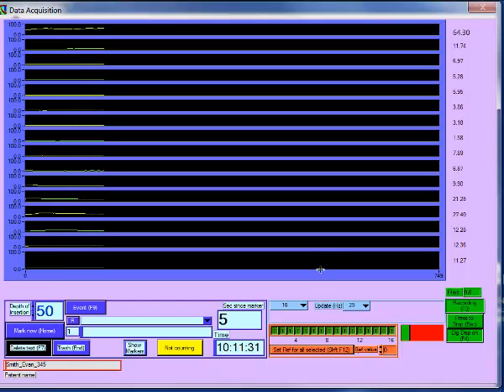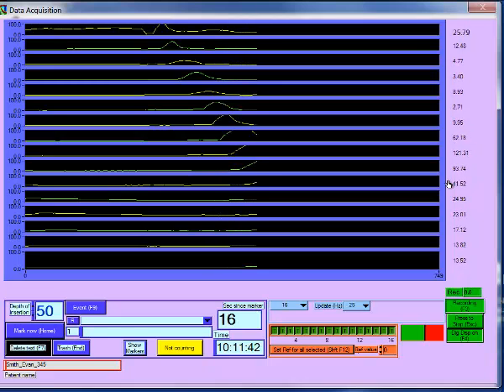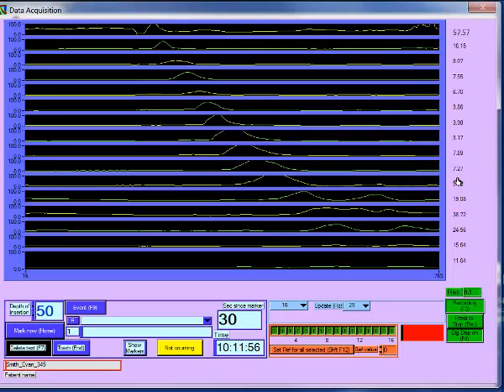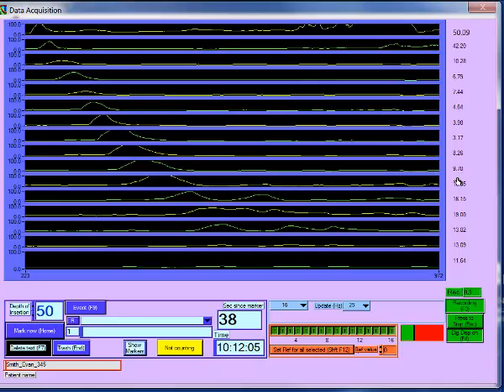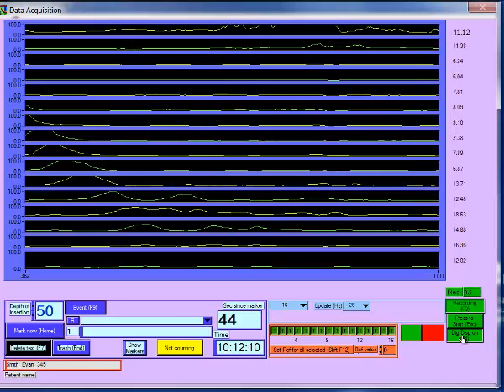When you enter this screen, you will see the current data in the graph at the top of the screen. By default, this displays 16 channels, and the digital values corresponding to each channel are on the right. Check the digital values to ensure that the perfusion pressures are stable and approximately what you expect. Because this is bringing in the demonstration data, they are of course changing, but normally if you are perfusing flat or underwater, they should be quite stable. You can turn the display of the digital channels on or off using the digital display button.